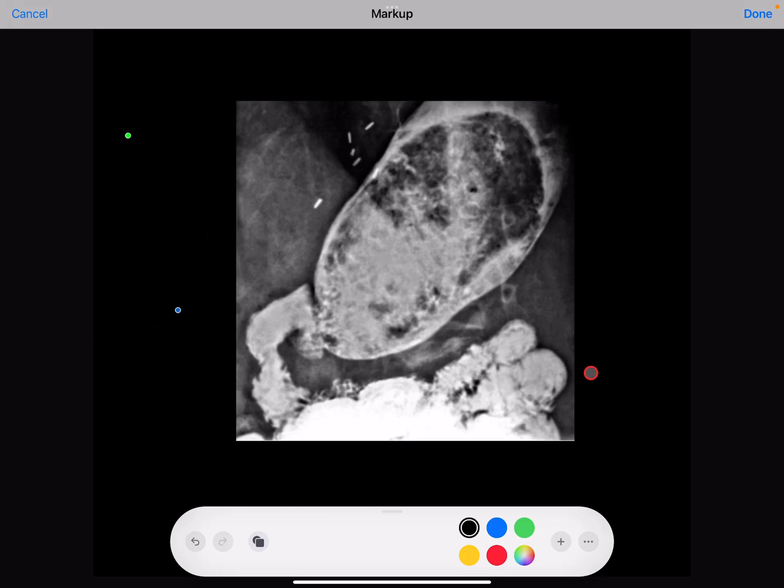This is another case. This is a barium follow through study. As you can see, barium material inside the stomach, duodenum and jejunum. You can appreciate small surgical clips here, here one, and you can see that the stomach is small in size and is distended and has a mottled lucency mass that is giving the filling defect in the stomach.